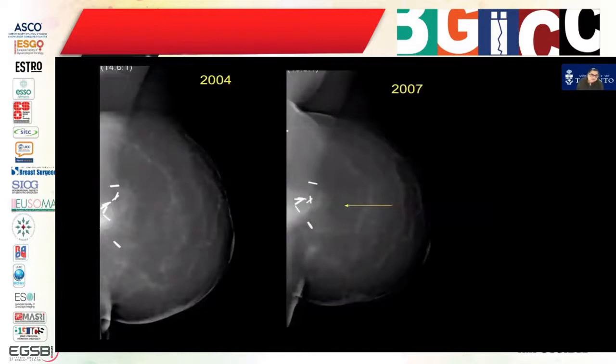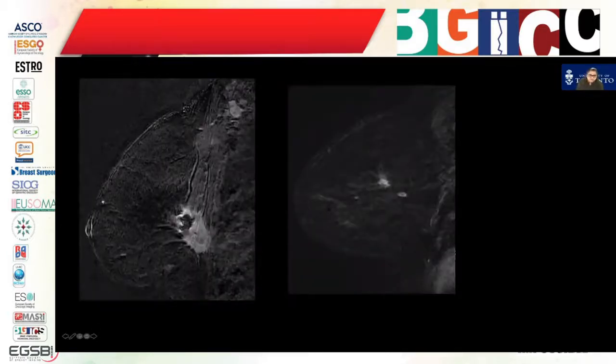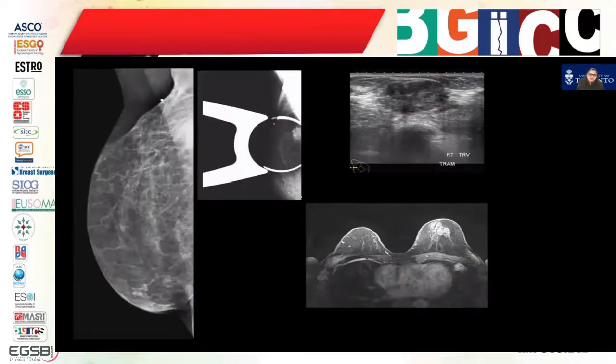So here's an example of a woman, 2004 to 2007, 3 years, she decided she didn't want her TRAM to be evaluated. At 2007 it looked a little bit different. There was more tissue posteriorly which looked abnormal. Obviously she had a TRAM recurrence, and you can see how when it is deep it's not palpable and it involves the muscle directly, so the prognosis is worse in terms of management and everything. And she also incidentally was detected to have a contralateral cancer.